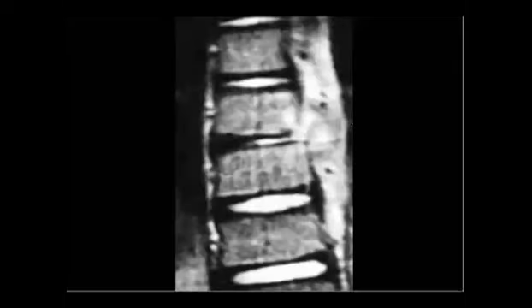Okay, let's go to the MRI, maybe confirm our appearance, and we can see that there is disc narrowing, as you mentioned. Then in the MRI, you describe it by signal intensity. So is it increased signal intensity or decreased? It is increased, and you can see the paraspinal soft tissue.